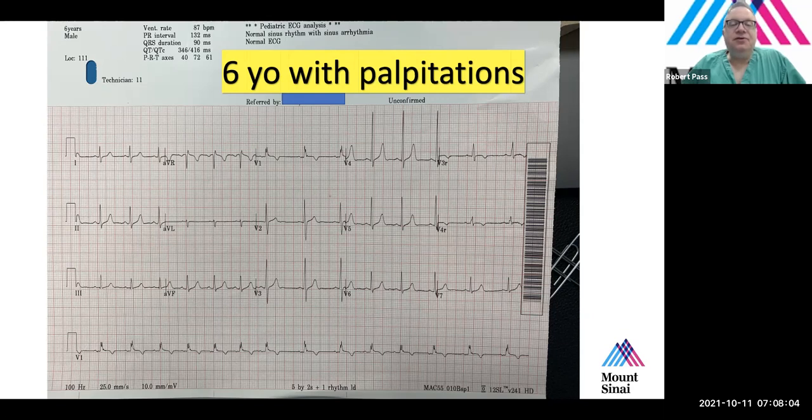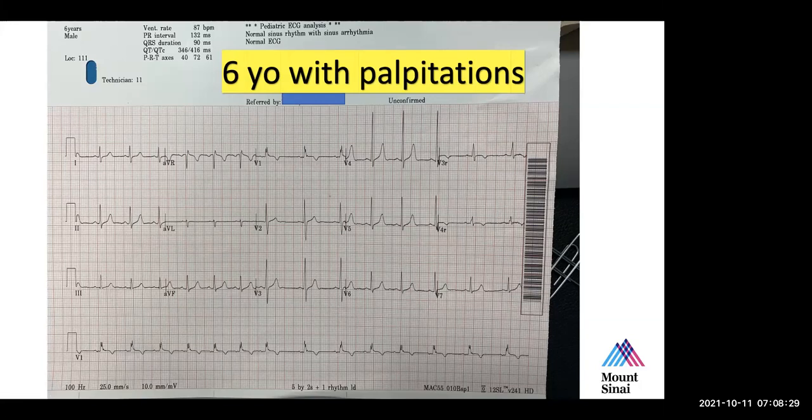Just so you know, we've reviewed this particular tracing fairly recently in EP conference. But do you think that all the P waves in the rhythm strip, on the V1 rhythm strip at the bottom, which I'm pointing to over here, are all the same P wave? Yeah, I think it does change some, like it's not biphasic anymore. At the end, it's only positive.